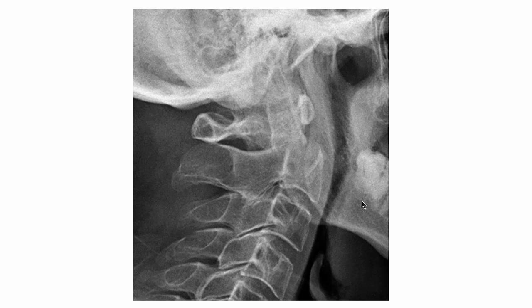There's your quiz for you. What's going on here? Well, let's check. Anterior longitudinal ligament. Those look in line. Posterior longitudinal ligament, I could draw a line down here. They look in line. Let's check the spinal laminar line. Looks good, looks good, looks good. Whoa, what happened? It's way back here.